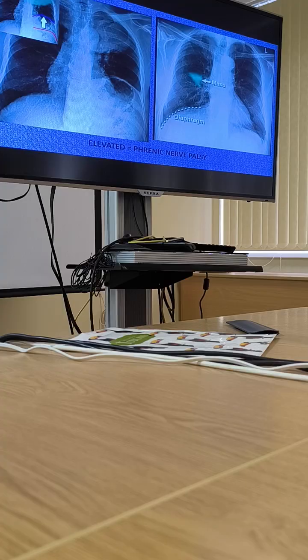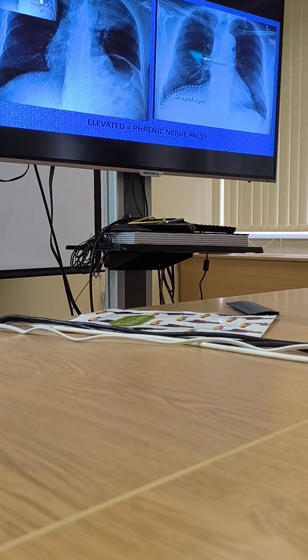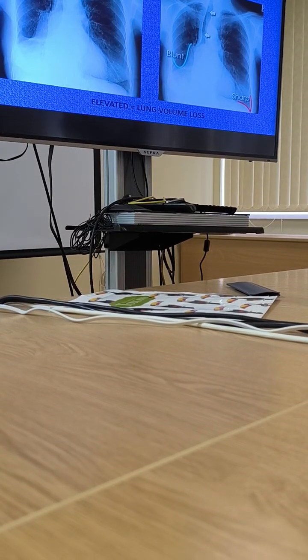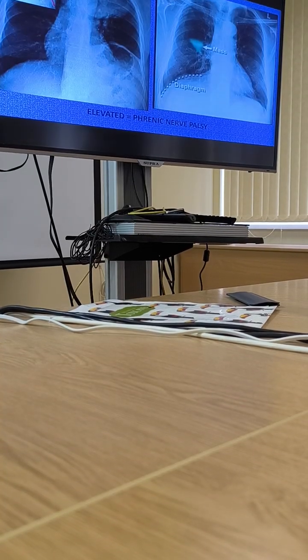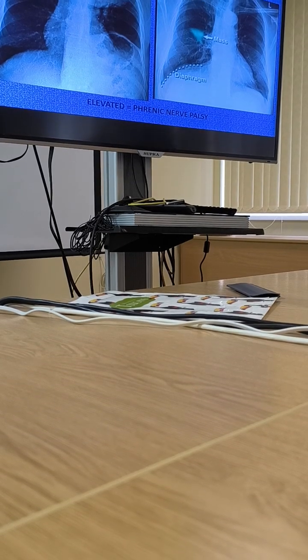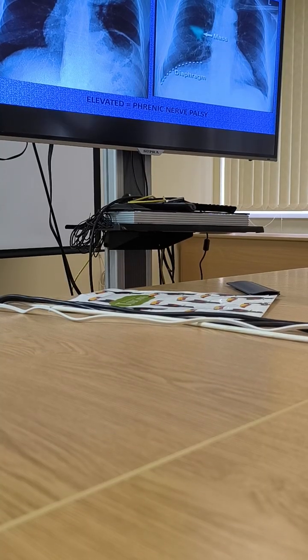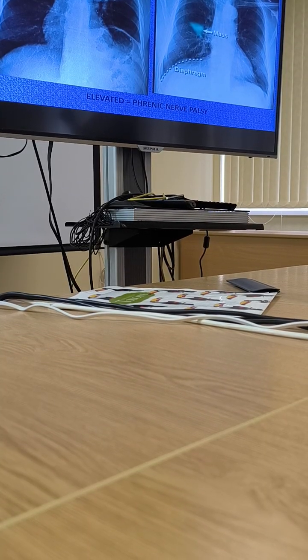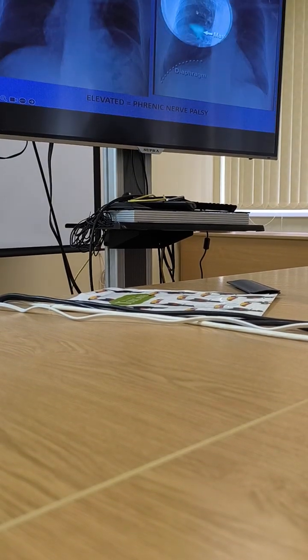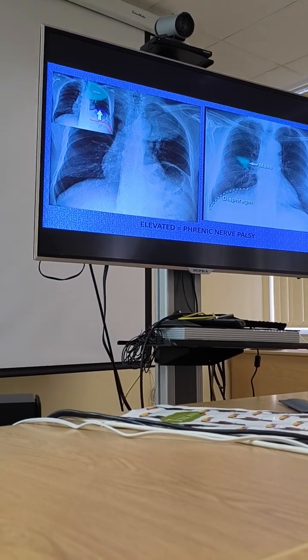When the diaphragm is elevated but without mediastinum shift, it's like an up-level position. In this situation, it's a little bit of a special shape. But in this situation, it's just in an up position. And this is named phrenic nerve palsy. We see this in a situation when tumors are compressing the diaphragmatic nerve, and it doesn't work. It could be an apical tumor or a really typical central tumor close to the hila.